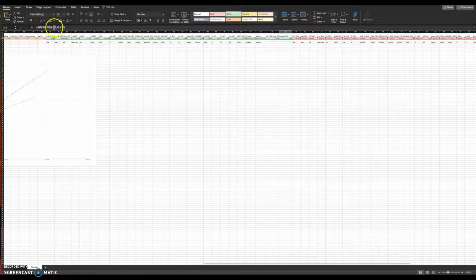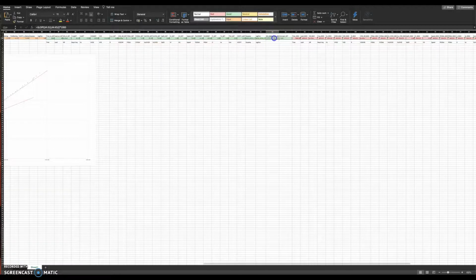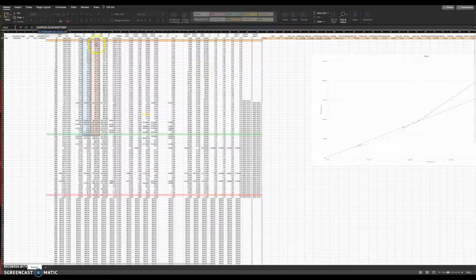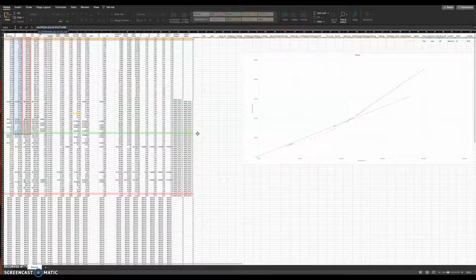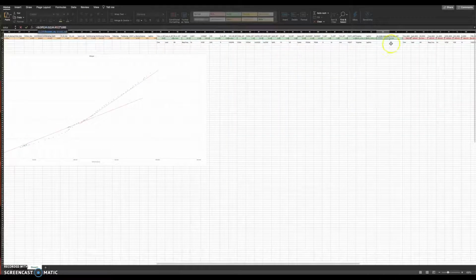And then the intercept. The intercept is the point that that line intersects the y-axis. I'll illustrate this a little better for you. If I double click into this, you'll see that we're calculating the slope of that. The reason I put in 52 is because I wanted to stop there. So it's calculating the slope of all these dots from there to there. This here is what's called S1. This here is what's called S2. It's kind of an S3 up here, so I'm not too concerned about that. So that's what we've done there.